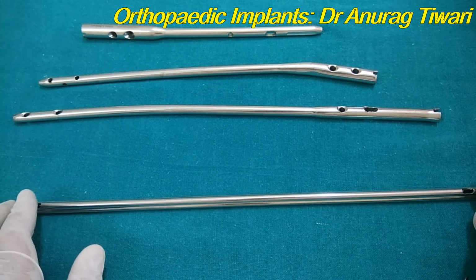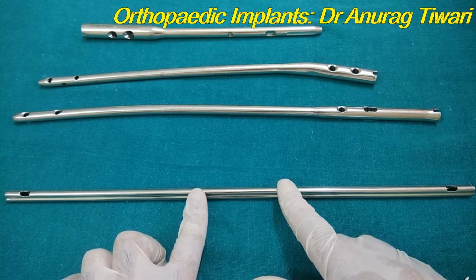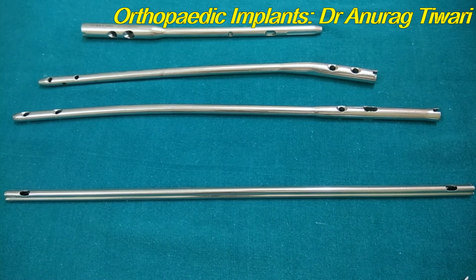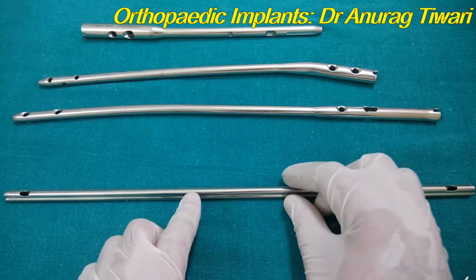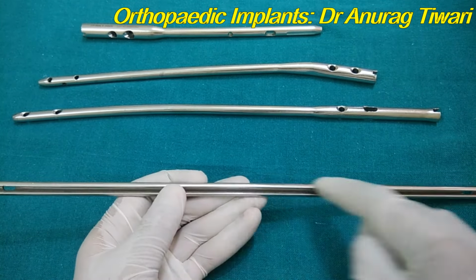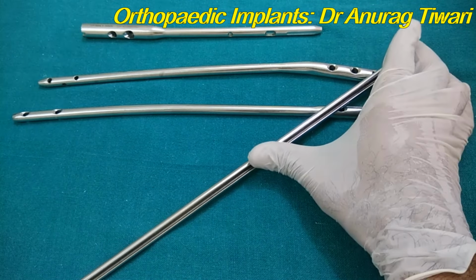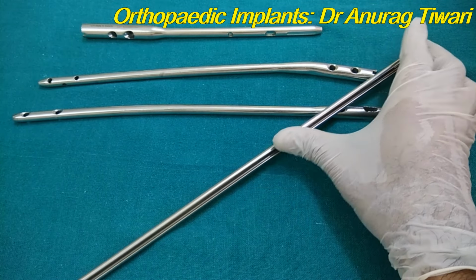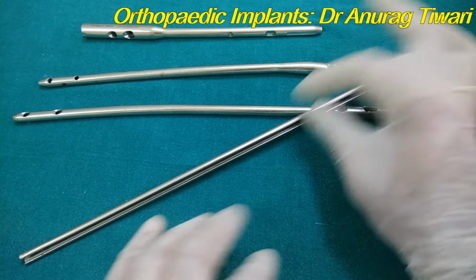And another question they usually ask is, if you have the 8 mm size nail and the diameter you need is the 9 mm nail, and you do not have the 9 mm nail on the table, then what will you do? So you can combine the 8 mm nail through this slot. You can combine the two nails, and now the effective diameter will be 9 mm. So that is how you can increase the size by combining the two K nails.